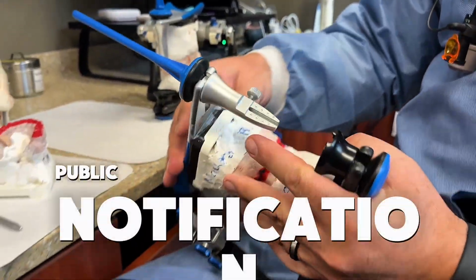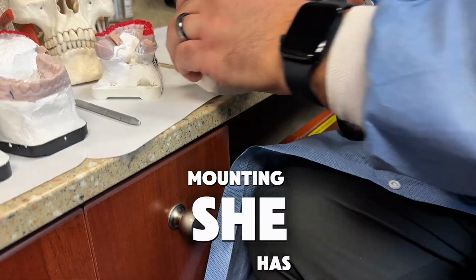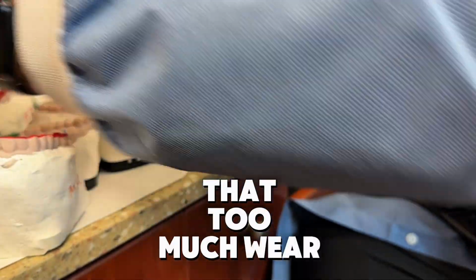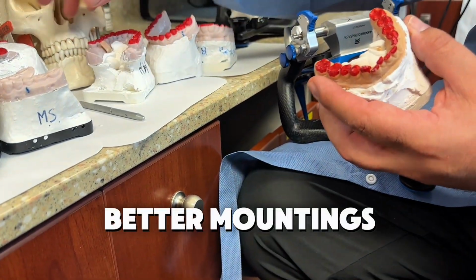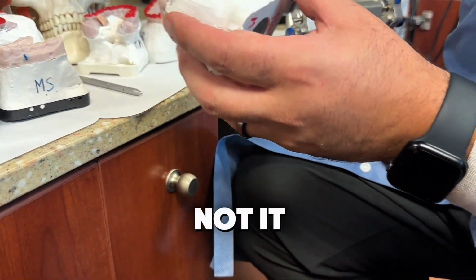All right, now we're looking at the patient. Okay, this is actually bad mounting. Bad mounting. She has a lot of wear. Too much wear. Try to find someone that doesn't have as much wear. Who's this? I need someone with better mountings. You don't have a matching color of the model, so maybe that's not it.